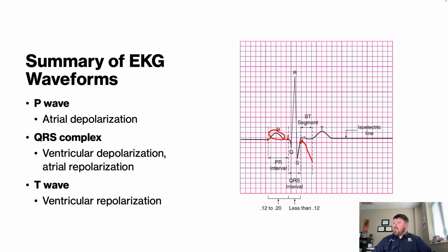And then you've got your T wave. Now, we won't necessarily identify the T wave on our 5 basic steps that we're going to talk about soon, but it will be a very important player whenever we get into looking at ST elevation, depression, and identifying areas of MI. So it is very important for us to have a good standard, very baseline understanding of what these waves represent and how to identify them on the ECG monitor.